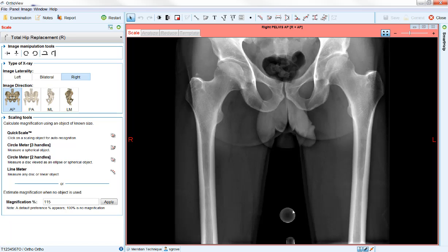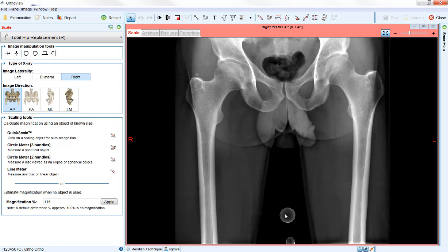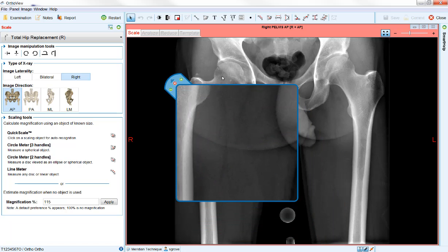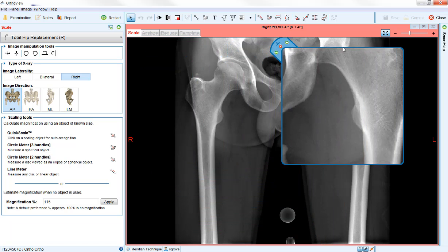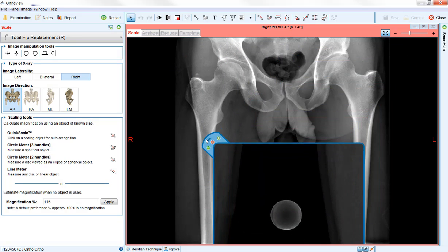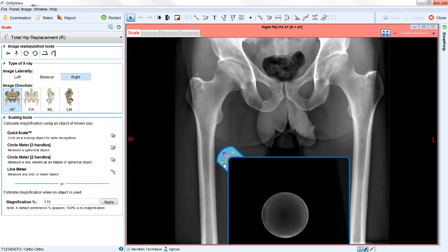Alternatively, press the space bar at any time to engage the magnification window. It will be centered on the current mouse position, allowing you to work and manipulate objects in the magnified view. The spacebar toggles this window on and off. Once open, click and hold down the left-hand mouse button on the border to drag and reposition the window. Clicking and dragging on the tab allows the box to be resized, and clicking the green plus and minus symbols allows the amount of magnification to be adjusted.